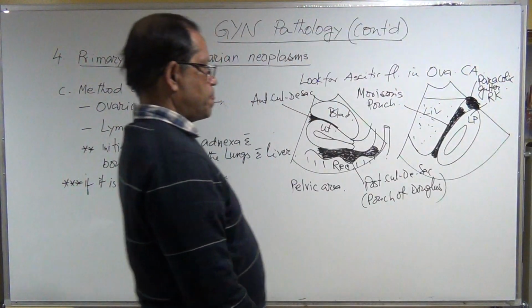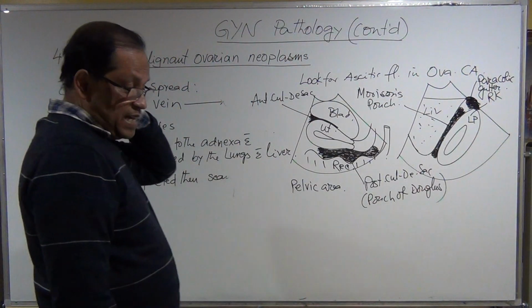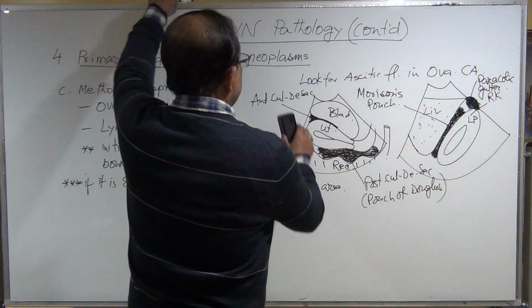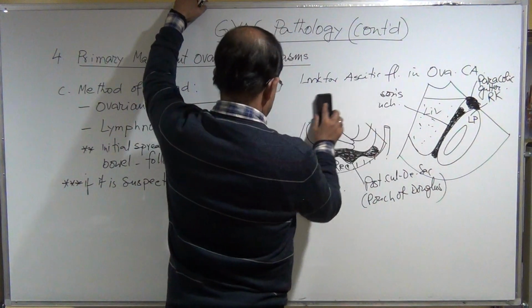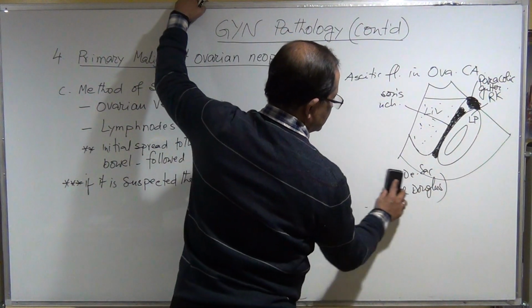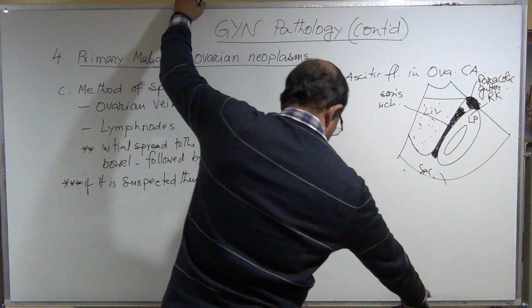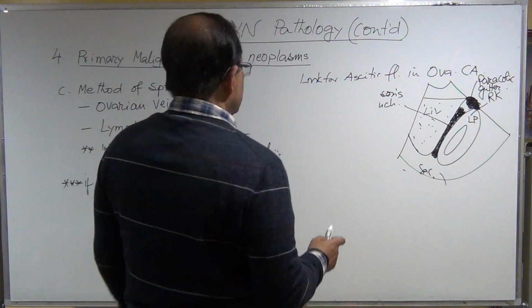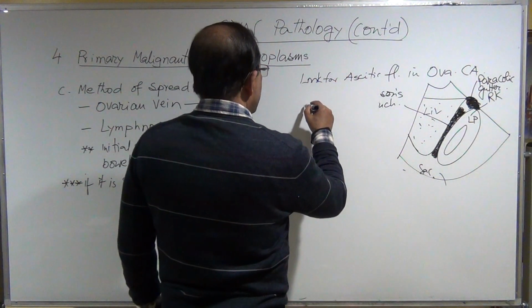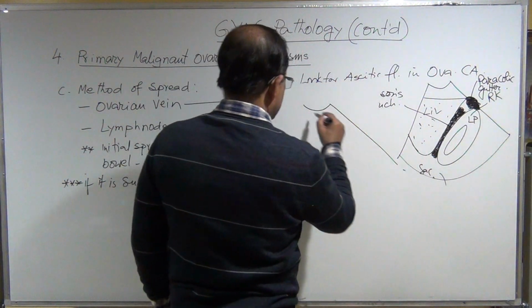Paracolic gutter. And if there is a huge collection of fluid, then you will see the fluid above the liver and below the diaphragm.